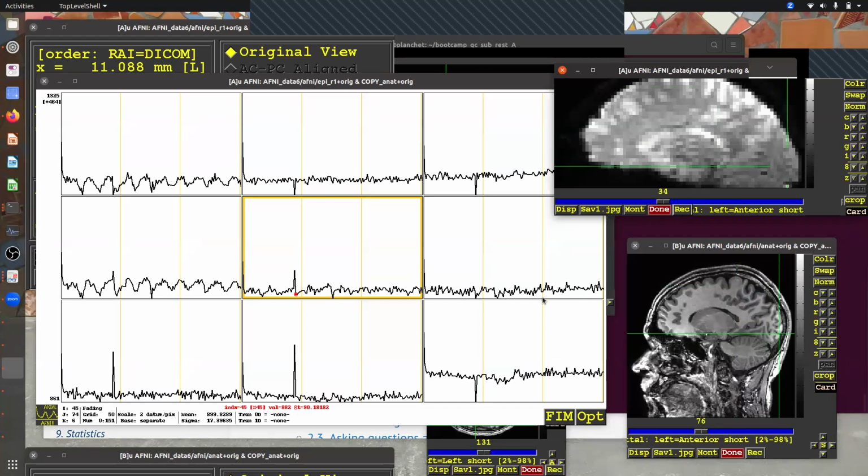Yeah, there's something different. Mostly what we've been looking at so far looks like this, or maybe like these. These two here are decidedly different. They have something else happening there. There's kind of a tooth or a boxcar, right? They look like train cars coming by. Still noisy, but there's something else, like a definitive pattern.